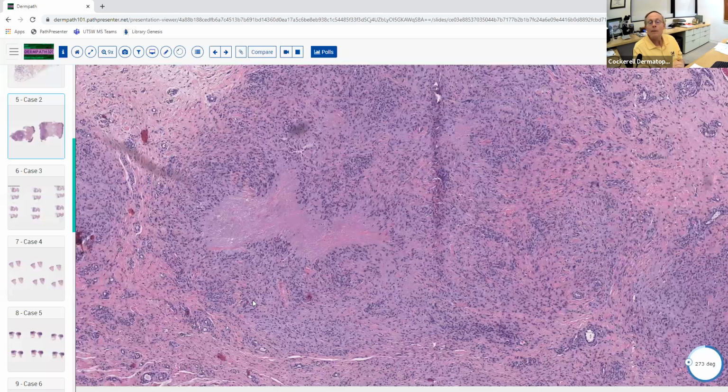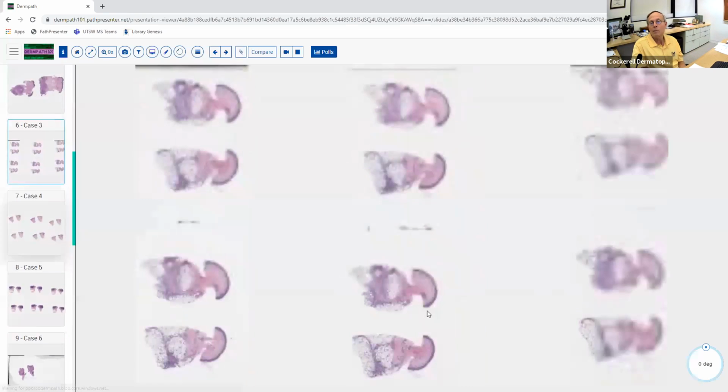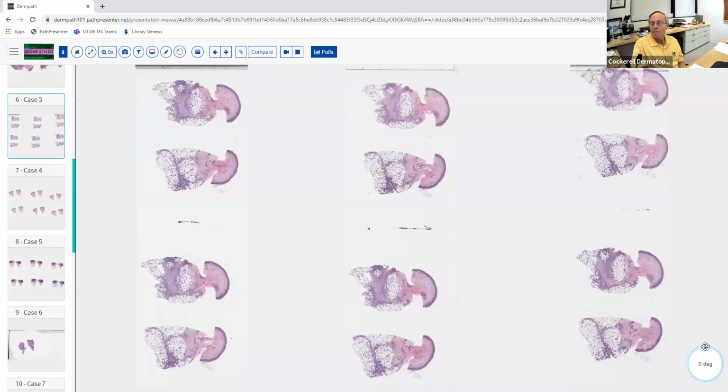And that actually will stain positively with cytokeratin and also with vimentin. So that's one other thing. And then rarely you can see the caseating granulomatous dermatitis because it gets a central caseation, kind of simulating a palisaded granuloma. That usually is mostly degenerated collagen, and that can be associated with or caused by an infection. So you want to make sure that you're not missing an infection too. So those are just a couple of things to think about.